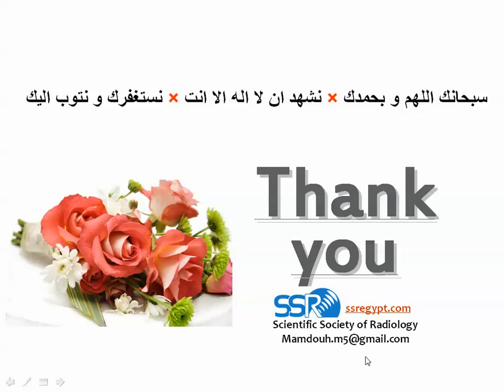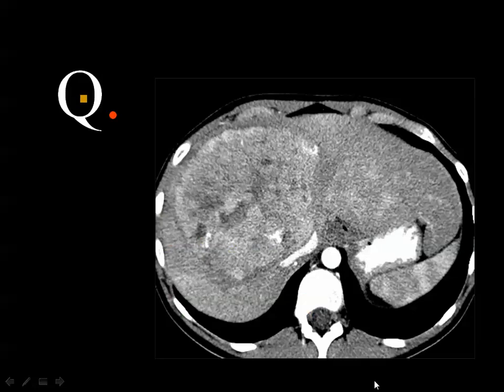This film reading session on the GI imaging, where this is the first case. Okay, and this is the contrast enhanced CT scan of the abdomen after oral and intravenous contrast at the level of the liver, and there is a big lesion in the right lobe, and this lesion is heterogeneously enhanced. This is arterial phase.